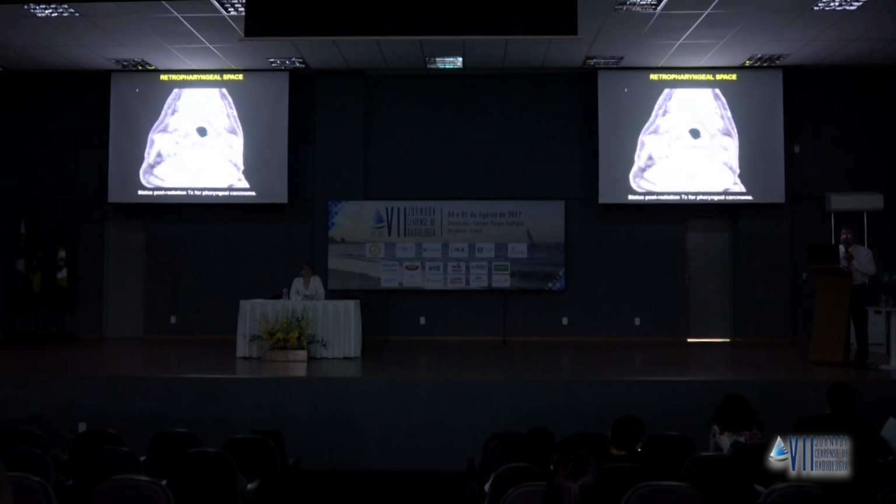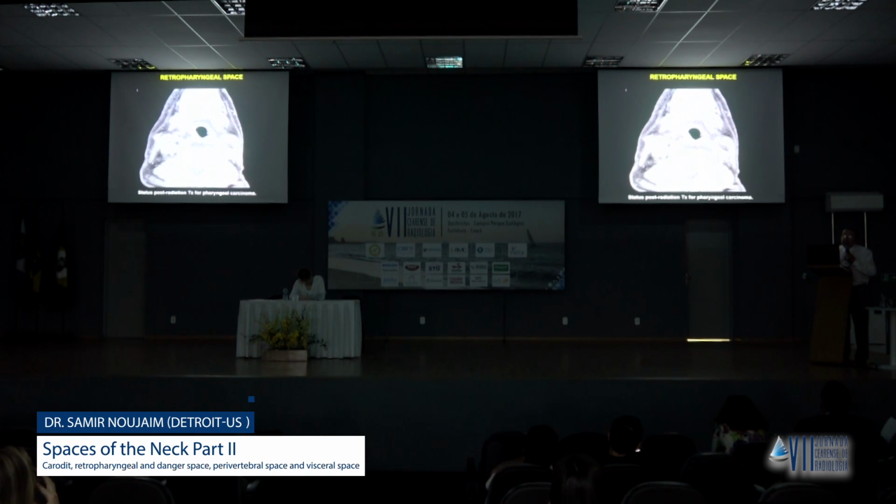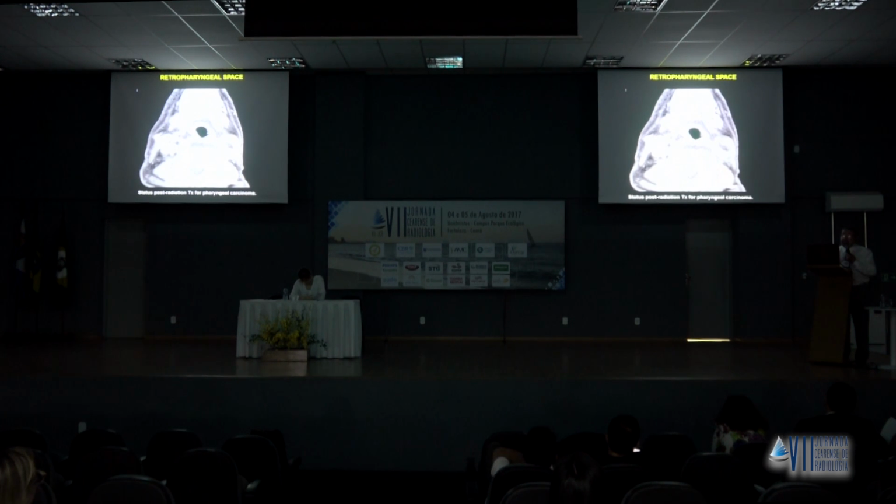Other things, a lot of patients post-radiation to the neck, they developed, in this case, for example, a tremendous amount of edema in the retropharyngeal space. Don't call that abscess. This is lymphangitis following neck radiation treatment with stasis of lymphatic tissue and the fluid accumulating in the retropharyngeal space. It's very easy to say that this is post-treatment because you see very small submandibular glands due to post-radiation adenitis. You see thickening of the platysma. You see striation of all the subcutaneous tissue, classic for that.